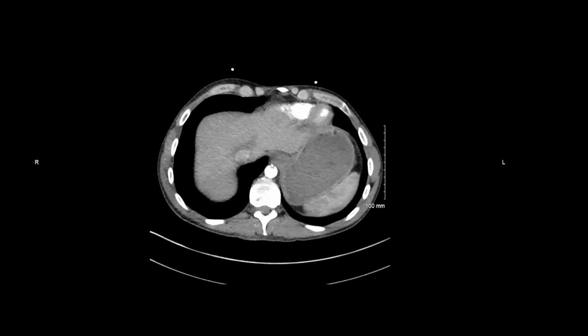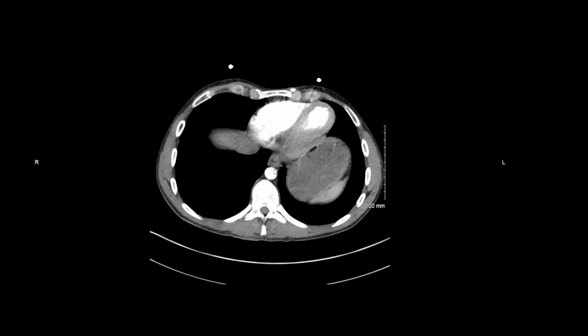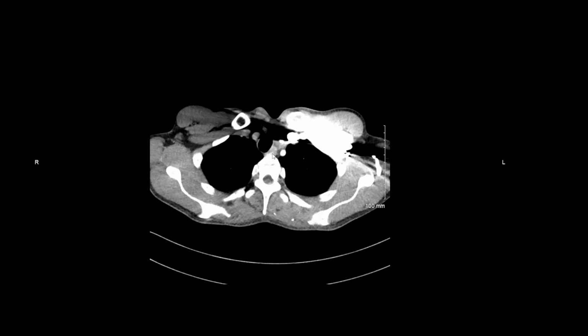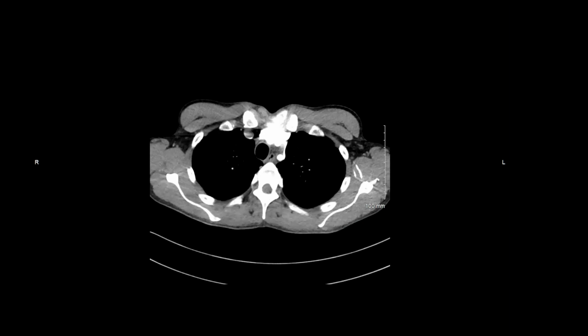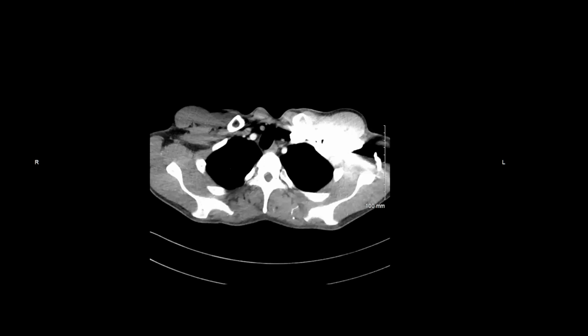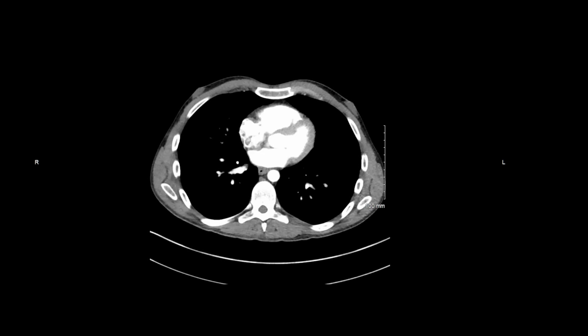From there, I'm going to look in the middle mediastinum, around the esophagus, for any paraesophageal adenopathy, and at the same time assessing the esophagus for caliber and wall thickness. I then will proceed to look in the axilla for any subpectoral or axillary adenopathy on the right and left side, scrolling back and forth. Having seen no adenopathy, I will now turn my attention to the heart.